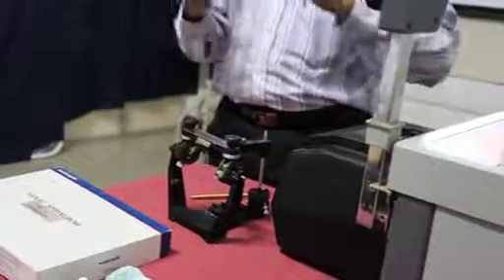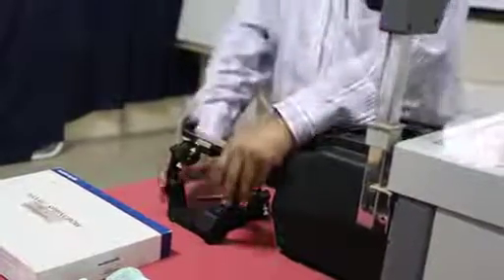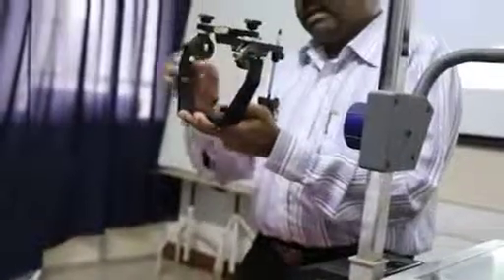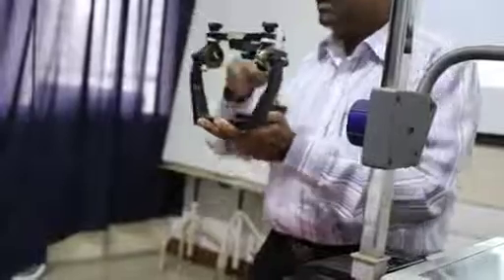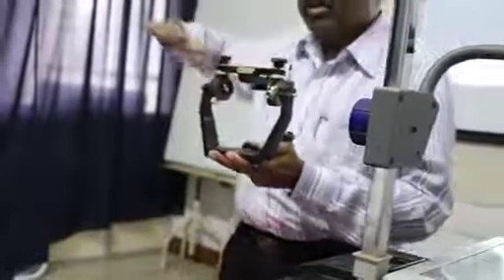The function of the whole thing is never a straight line. The whole body, you can see, is never a straight line. In the same way, we have the whole condyle element here, and the articulator that moves in synchronization with the movement that we see in the mouth.